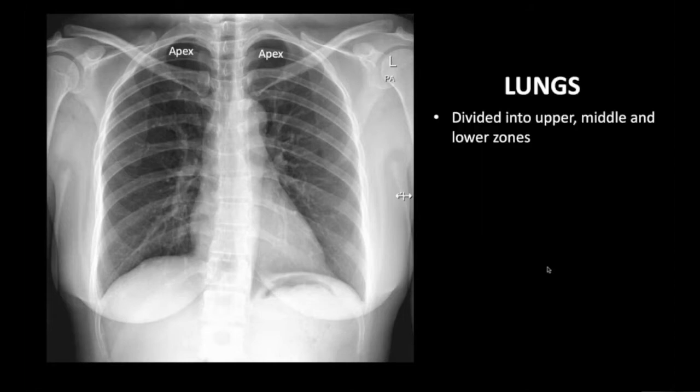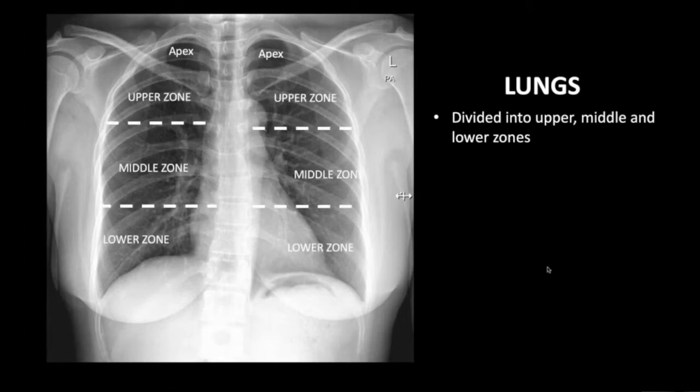Anatomically, the lungs are divided into 3 lobes on the right and 2 lobes on the left. However, on chest radiograph, each lung may be grossly divided into upper, mid, and lower zones, each taking 1/3 of the overall height. Remember, zone in this context is not interchangeable with lobe. 2 lobes of the same lung may overlap and share the same zone. It is advised to start with zone when describing a pathology on the chest radiograph first, before a specific lobe can be pinpointed whenever possible.